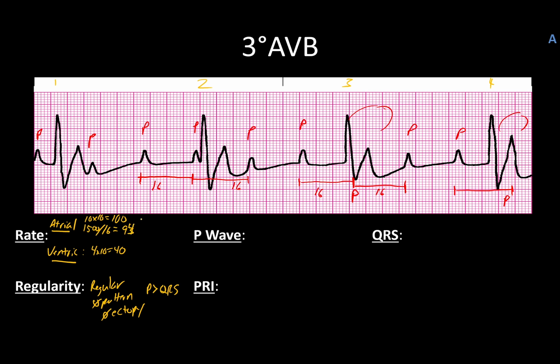Okay, so that's normal. However, my ventricular rates, we never did finish that one up. So if I just measure between these first 2, here and here, I get 34. This one is 44. So you're normal and you're Brady.